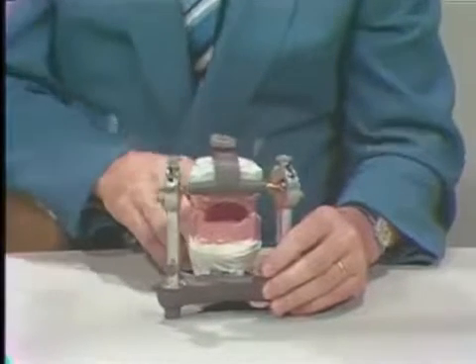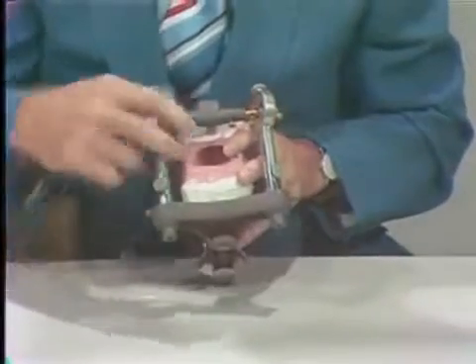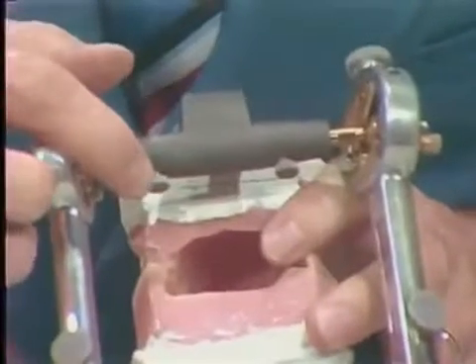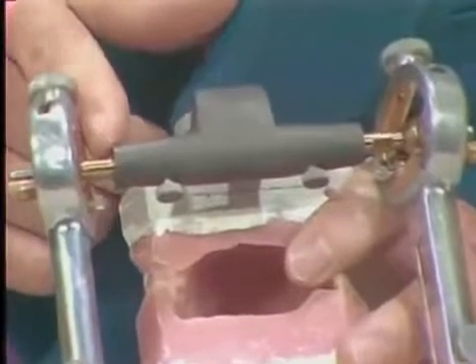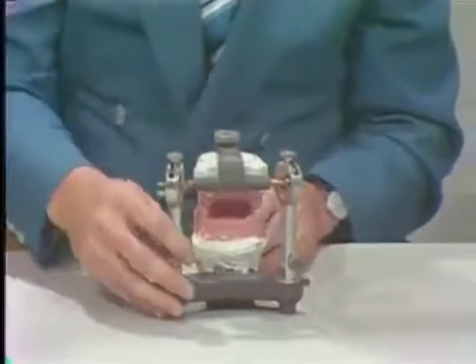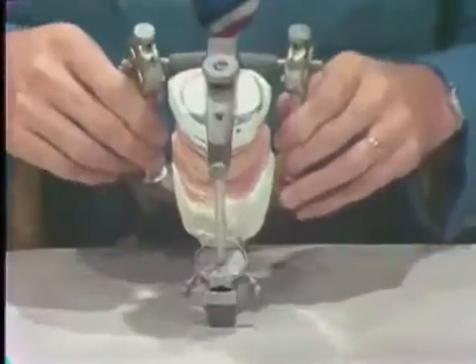Now if your incisal table is not centered, you'll find two little screws in the back, and these are lock screws, and they should be loosened. Then by taking a wrench on this flat spot, you should adjust that until your incisal pin is centered both in an anterior-posterior direction and also laterally, so that the pin sets in this manner.